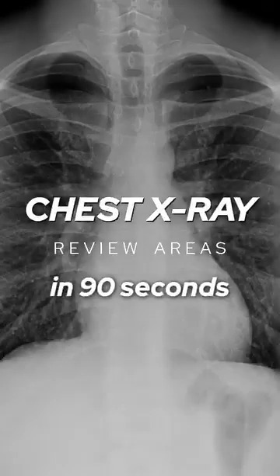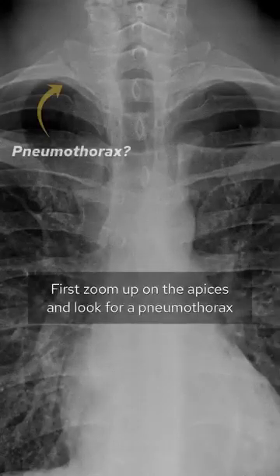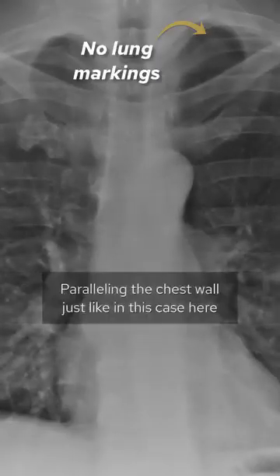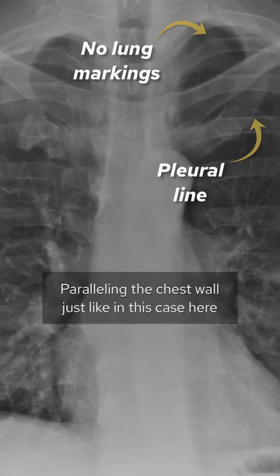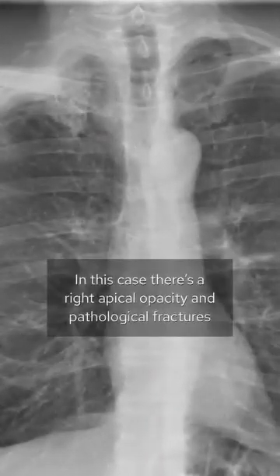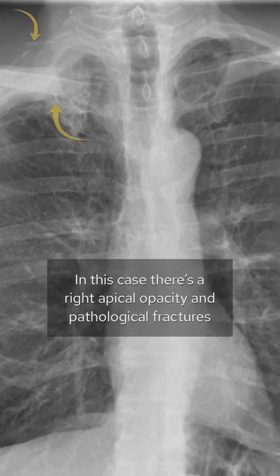Chest X-ray review areas in 90 seconds. First, zoom up on the apices and look for a pneumothorax by looking for a lack of lung markings and a white pleural line paralleling the chest wall, just like in this case here. Then look between the ribs at the apices for a Pancoast tumour. In this case, there's a right apical opacity and pathological fractures.